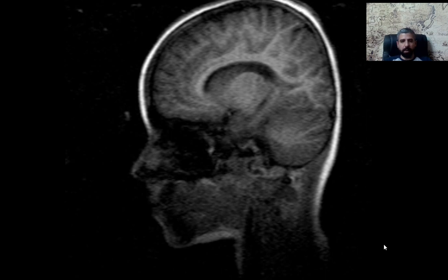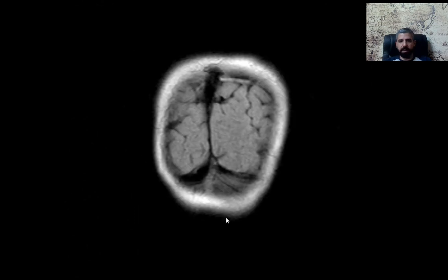And now today we will present case number 3 of an 8-year-old male child, presented with abnormal behavior and progressive limb weakness. A brain MRI was done for this child, and we will see the findings together. As usual, you are required to provide a diagnosis or differential diagnosis of the case in the comment section. After 24 hours, tomorrow, we will publish a video discussing the findings and the diagnosis and differential diagnosis.